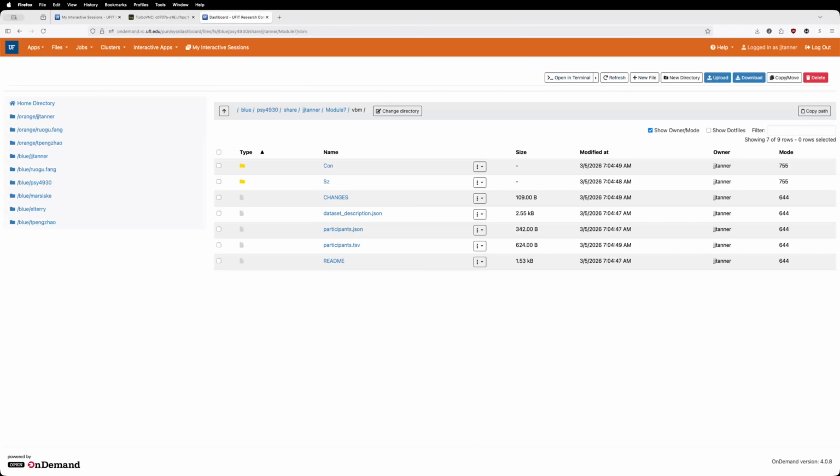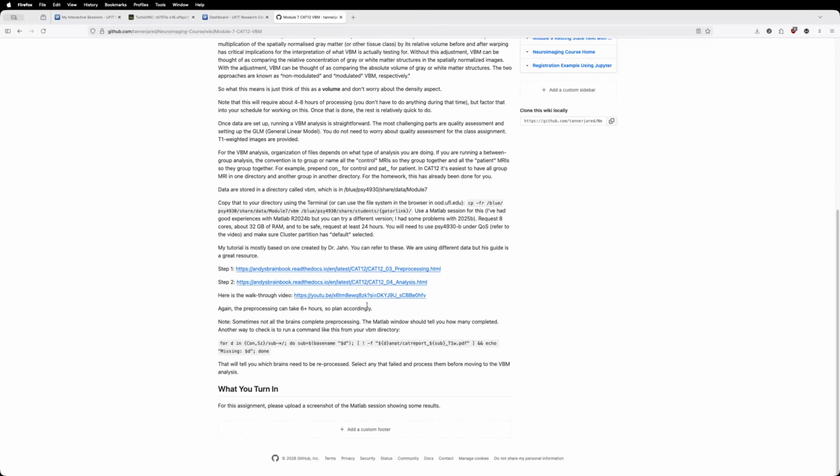Now this command will be updated as you run it. I just noticed a little error in that command, so I'm going to fix that really fast. Okay, the command is fixed. The only difference, it was missing a wildcard. It has to look in the subdirectory. And so it's going to look in this location for that. So you can copy this file path.